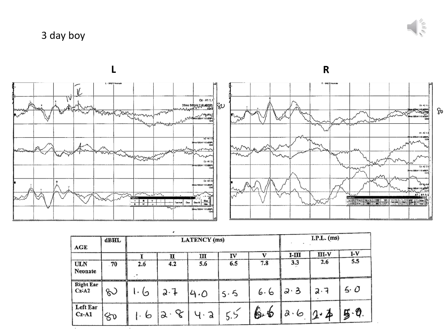Coming down to the numbers, again, a reminder that the absolute values are not useful at this point because we're looking at 80 decibel recordings when our upper limits of normal are at 70. But what's important are the interpeak latencies. And so looking at the 1-3 interpeak latencies, we'll see that the written numbers are below the upper limits of normal. So the 1-3 conduction is fine.